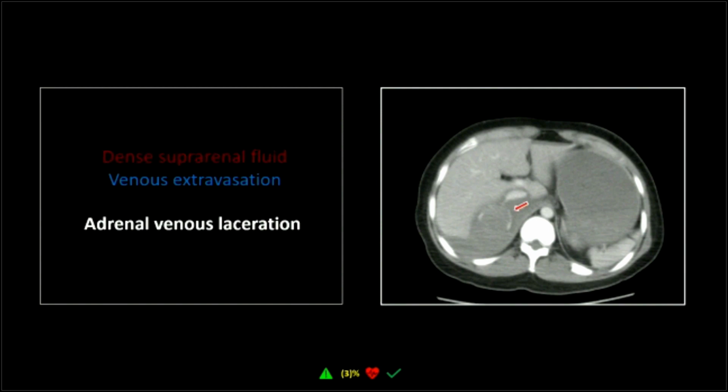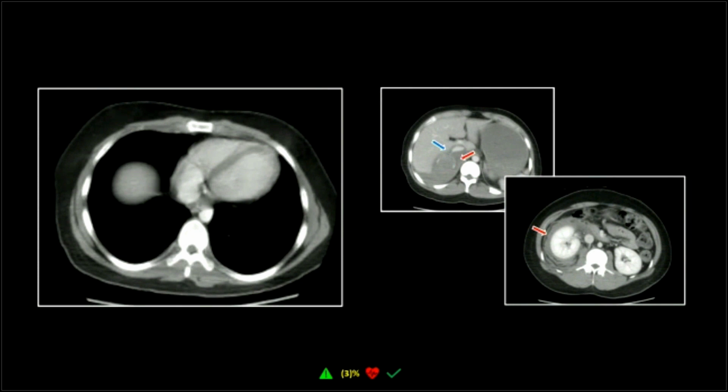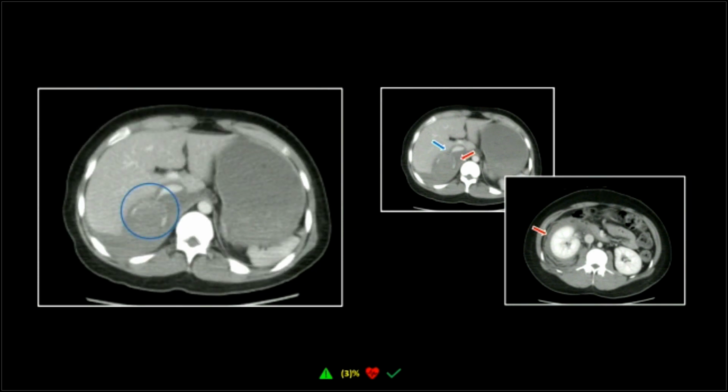And you can see right here, it's actually extravasating. It's avulsed most likely from the IVC right there. You can also see the adrenal is there in the gerota's fascia with the right kidney. So the hemorrhage is a little bit outside Gerota's fascia as well, but most of it is perirenal in the right perinephric space. So there you can see a little contrast around it.